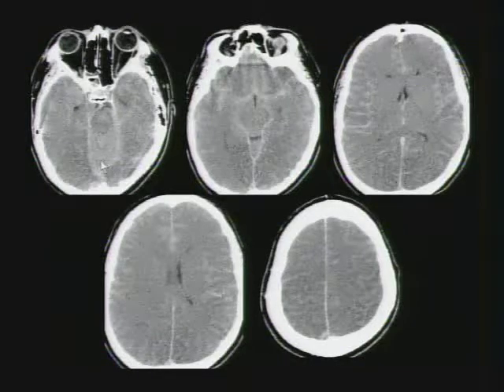If you look at the cerebellum, it's a little bright. If you look at the basal ganglia, you cannot distinguish any of the elements of the basal ganglia, and this is global anoxia. This is a classic appearance. It's frequently misdiagnosed as diffuse subarachnoid hemorrhage. Notice there is no hydrocephalus for a patient with diffuse subarachnoid hemorrhage. So global anoxia, loss of basal ganglia, white cerebellar sign, no hydrocephalus. Okay, a pseudo-pseudo subarachnoid hemorrhage.